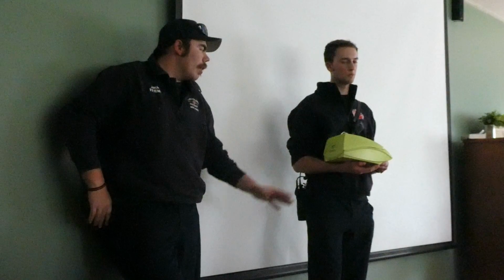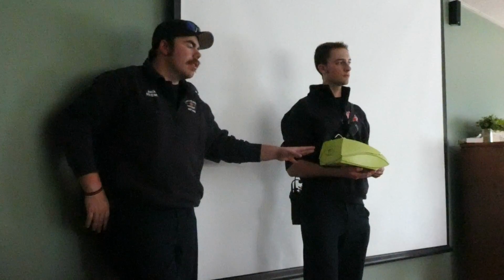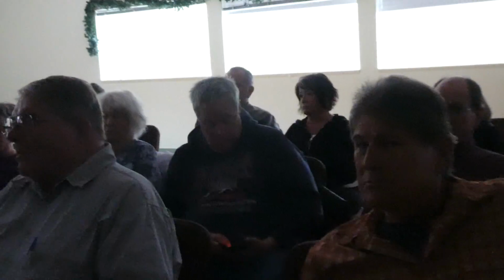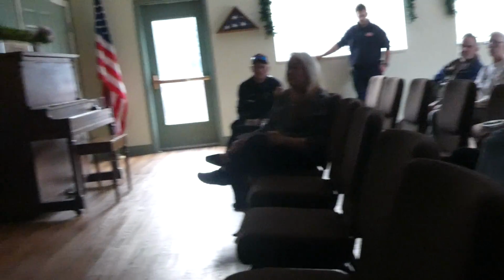If any of those are present, we have a more advanced one of these that we hook up stickers to, and it's like the hospital will take a picture of the heart. What it does is take a picture of the electrical activity of the heart. So when you see all the ups and downs like on TV, that's what it's actually reading, the electrical activity.